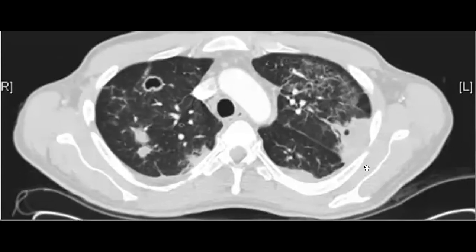So now after you mention the differential of multiple cavitating nodules in the lung, I see that some of you also mention rheumatoid nodules. Yeah, you can put it, but at the end, if your differential is not common. And okay, what else? Yeah. So I agree with most of the differential. I think that most of them will be nice to put. Wegener will be a nice differential, especially with the history. This patient, as you remember, we mentioned that he had hemoptysis. So one of the good differentials will be Wegener.